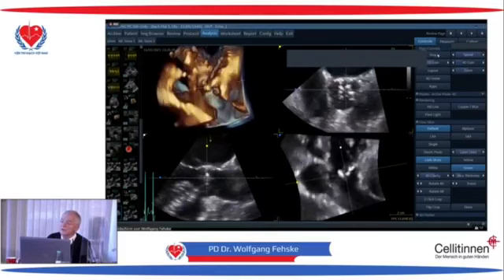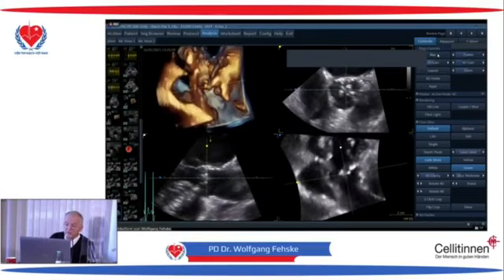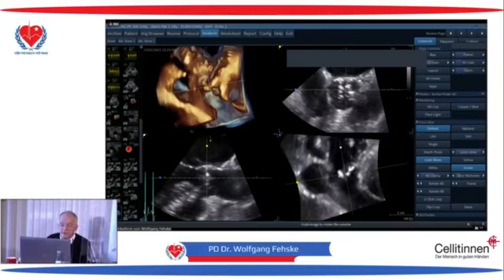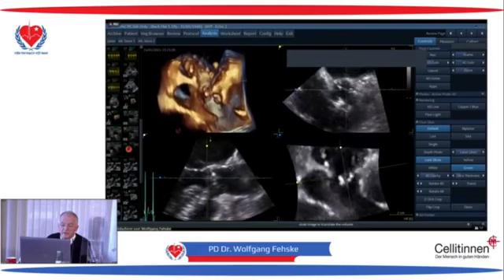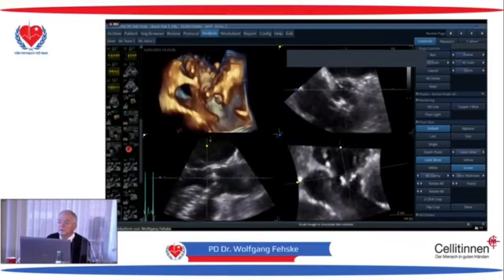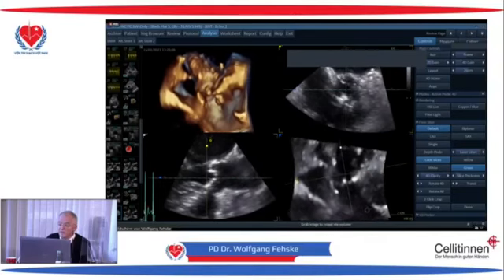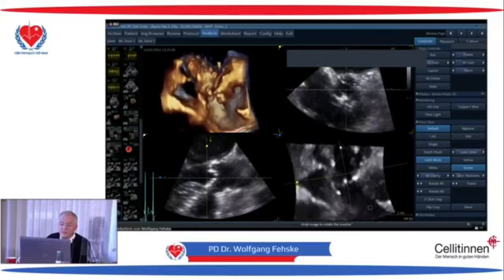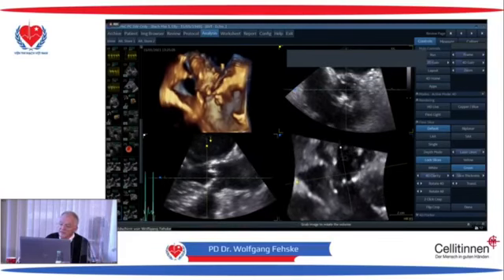And then we take out a systolic image. We go here and we put it there, and we must look that it is here correctly. And then you see from the images that it is the deepest part of the valve, and this is completely the centerline method.